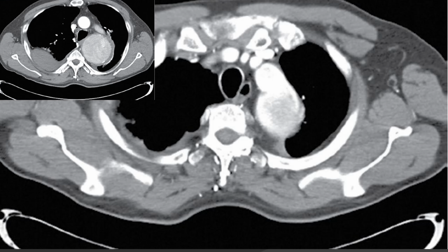Student doctor, can you explain findings on this CT study? Selected images from a CT scan of the chest confirm the presence of a large descending thoracic aortic aneurysm with a moderate right hemothorax and small left hemothorax.